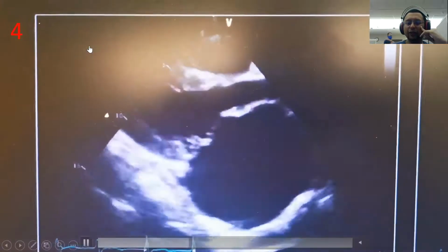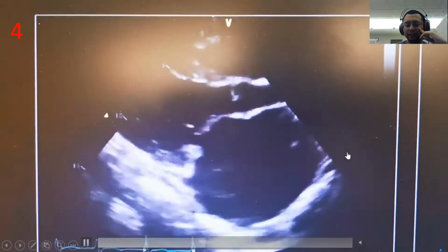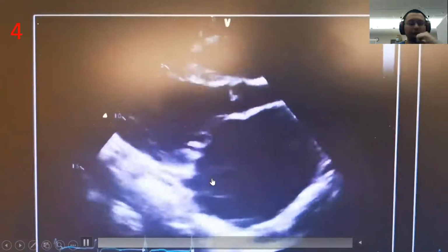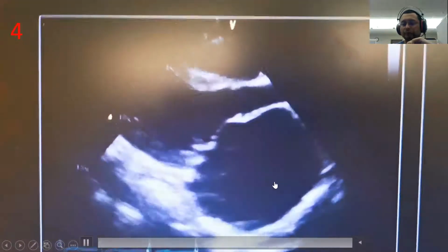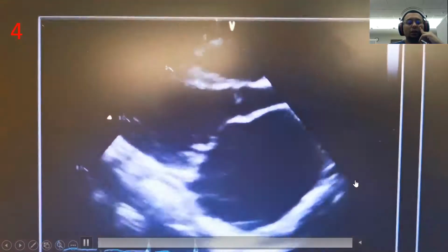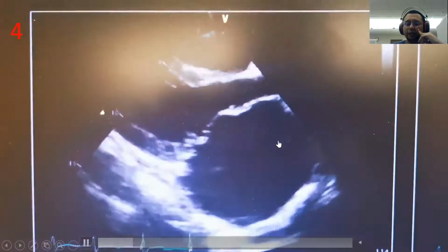So this is an example of AFMR. Ceiling said anterior prolapse, and I think that's very fair. You can see a bit of prolapse anteriorly, and the jet is directed posteriorly. However, can I ask something? Is it common to have, I mean, how much LA dilatation can happen in AF normally? A lot. It can be big, it can be giant also. No problem. Like this one is basically just from AF. This LA dilatation is just from AF.